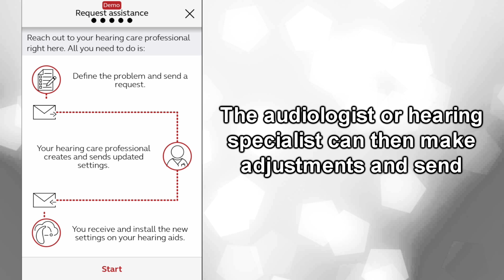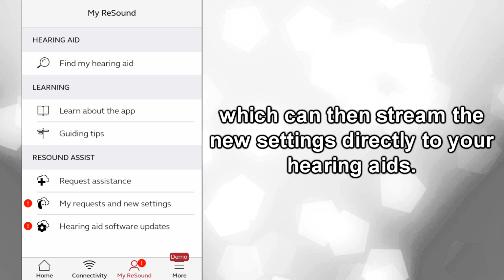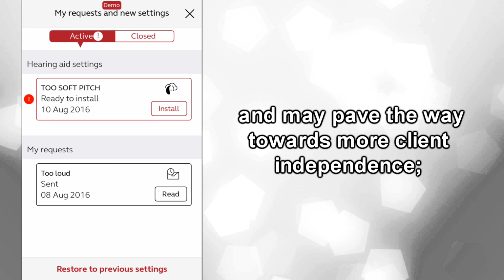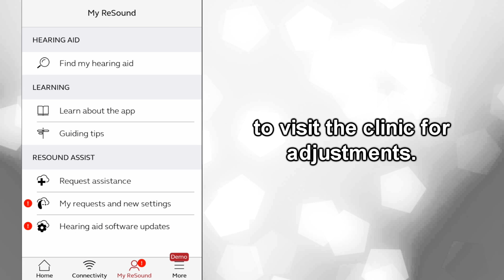The audiologist or hearing specialist can then make adjustments and send them wirelessly to your device, which can then stream the new settings directly to your hearing aids. This is potentially game-changing in the clinical approach to hearing healthcare, and may pave the way towards more client independence, as any problems can be solved through the application without the need to visit the clinic for adjustments.